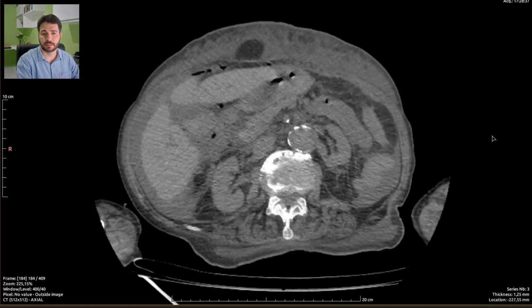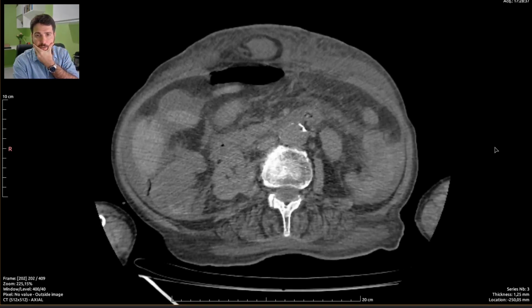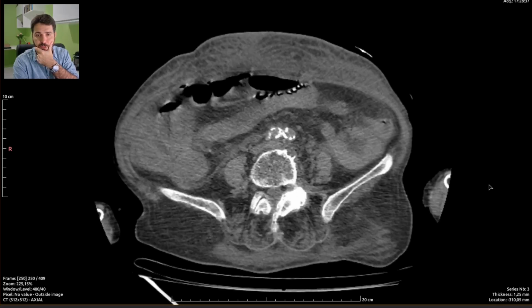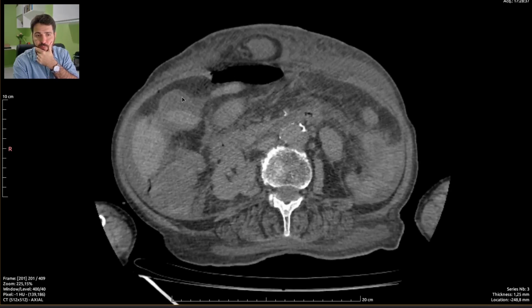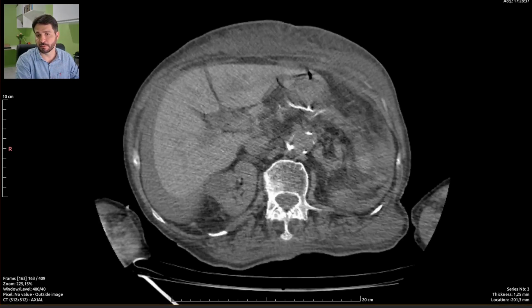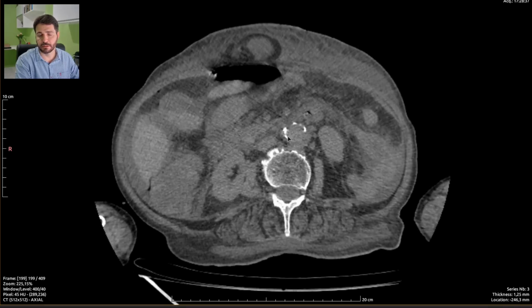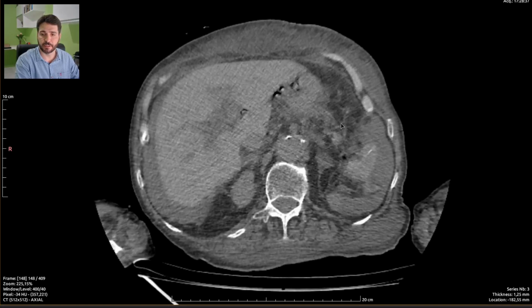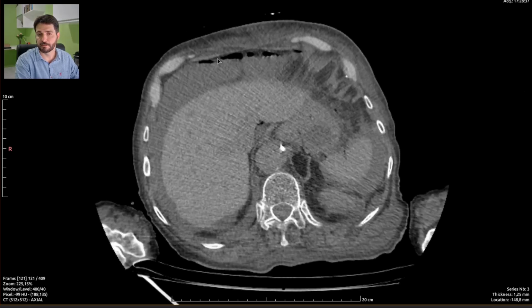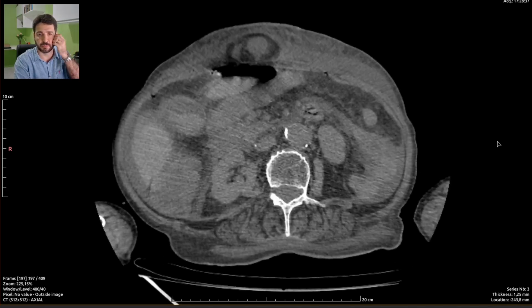Did you see the disease? The disease is right here. I can't really tell. And I can also tell this is an acute abdomen. There is pneumoperitoneum. There is free air inside the abdominal cavity, which is never good. And I can see here we have a major ascites. We have lots of pneumoperitoneum, which is a sign of acute abdomen.